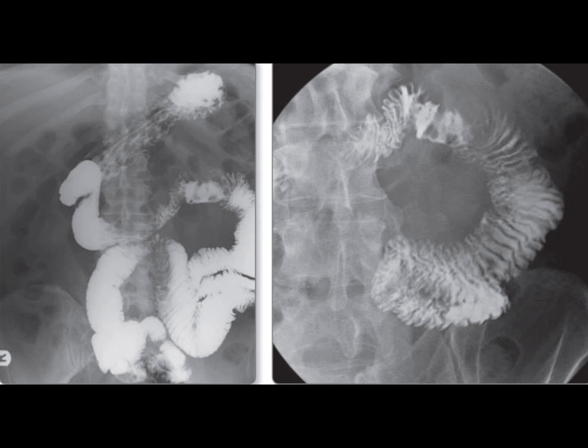Checking whether the terminal ileum has been imaged is important because it's a common site for focal small bowel lesions in Crohn's disease. Next, examine the space between bowel loops for any abnormal widening, which could indicate extrinsic pathologies. Mesenteric fat hypertrophy is often seen in Crohn's disease. If the case includes cross-sectional images, also look for enlarged lymph nodes and liver lesions, which may suggest malignancy.